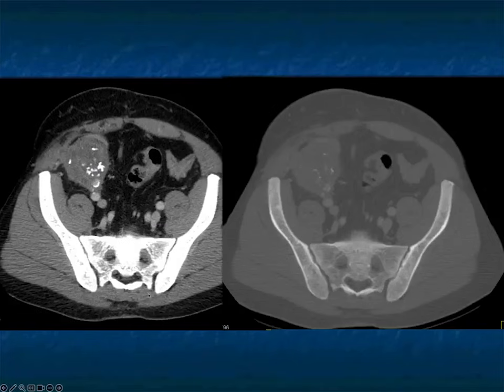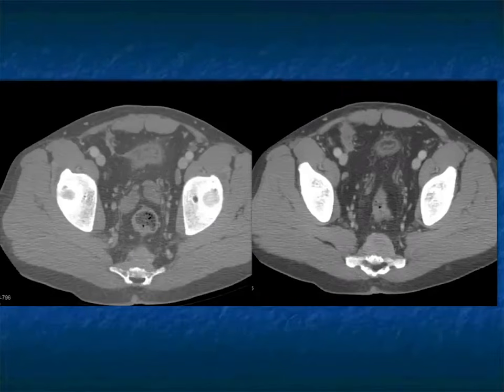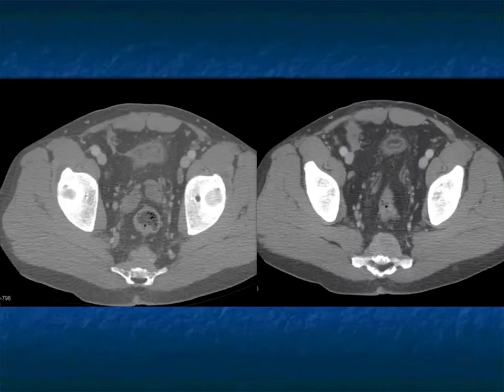What is that? Well, let's go further. The bones are coarse. Maybe it's from the renal osteodystrophy. Then there's a soft tissue mass. So now I'm saying end-stage renal disease, coarse trabeculation to bone, mass in the left lower lung, paraspinal, mass in the pelvis, presacral. What are we dealing with?